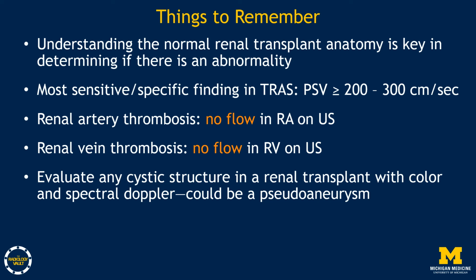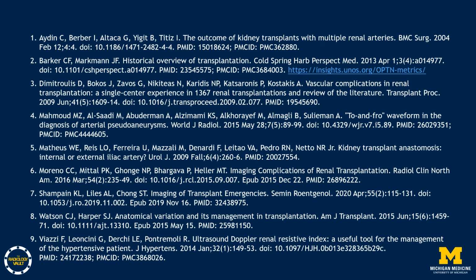You must evaluate any cystic structure in a renal transplant with color and spectral Doppler, as it could be a pseudoaneurysm. These are my references.